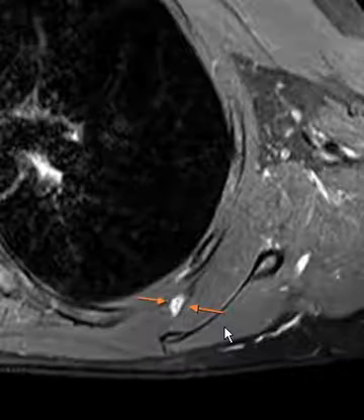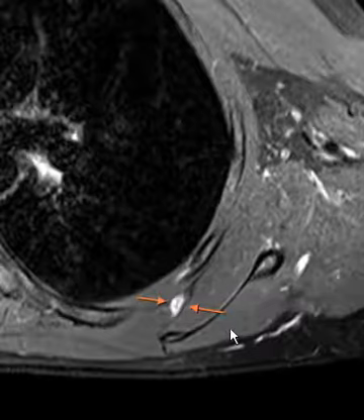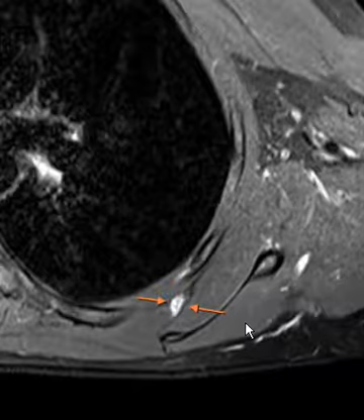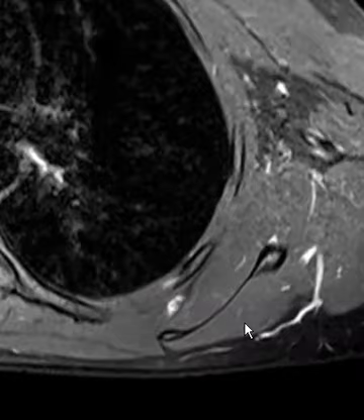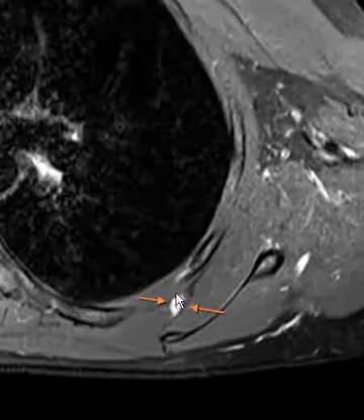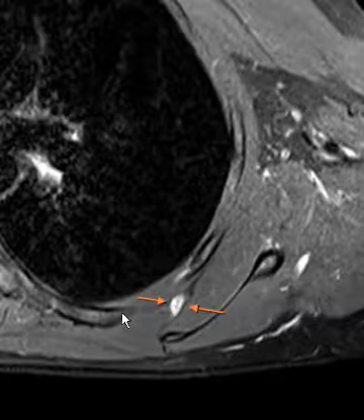Now the things that don't fit here, this is a young person, I think they're 29-year-old, it's a male, and typically the elastofibromas are in older females, so that doesn't quite fit. Also, this is very small and localized, where the elastofibromas are usually larger, and some of them can be really huge here and elevate the scapula.